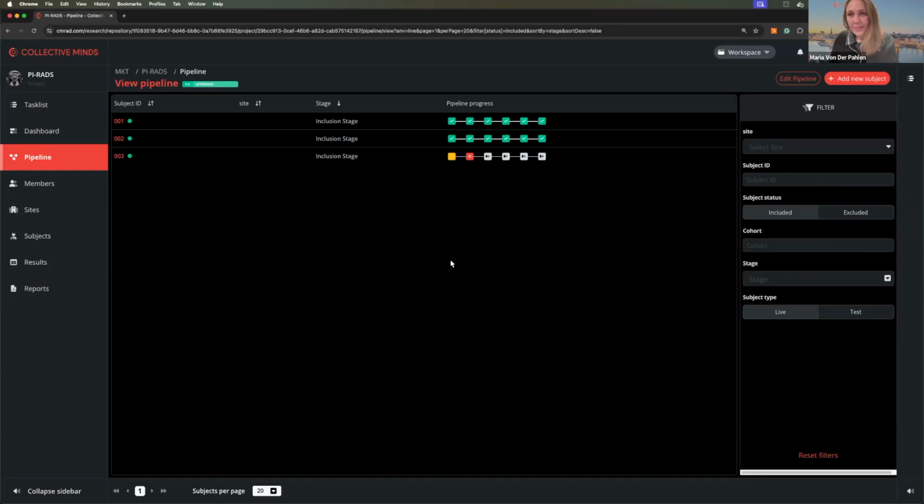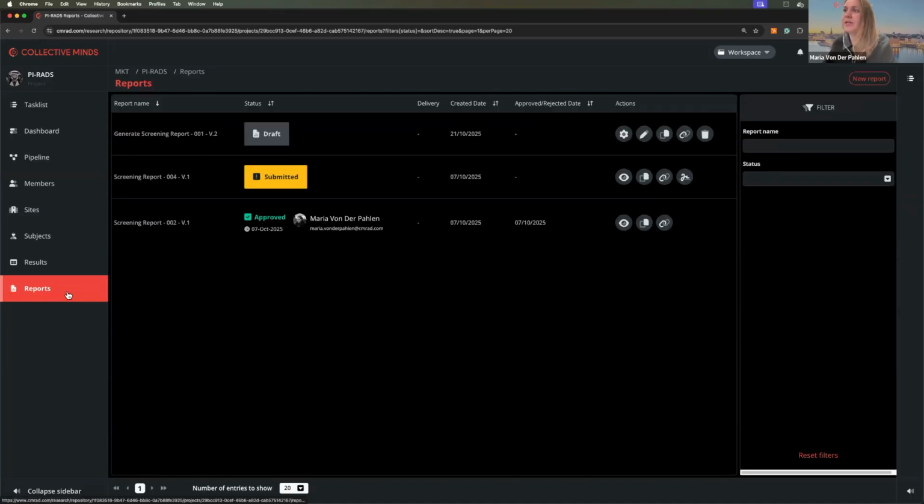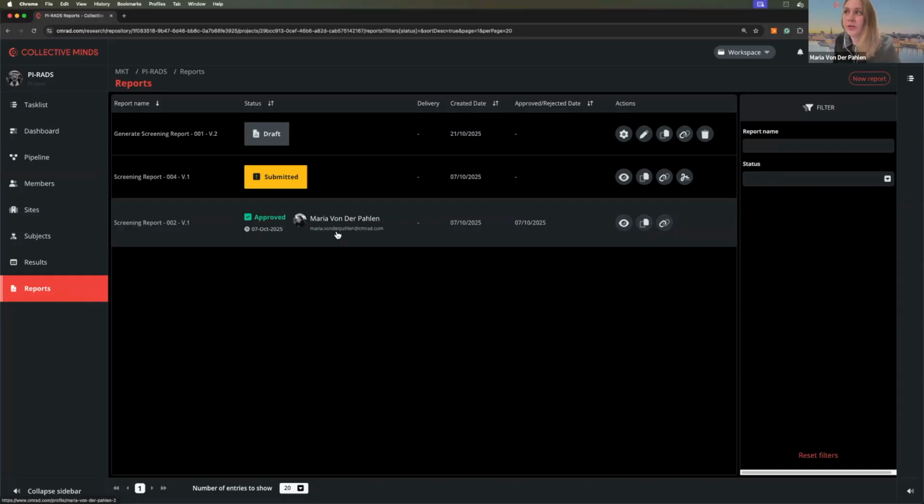So at this point in time, an email should go out to the receivers and they get notified that a new report is available on the platform. So to find that report, you simply go to reports down here to find all the reports. Here I have already included 2 earlier ones, so I could show you the different status of the reports.